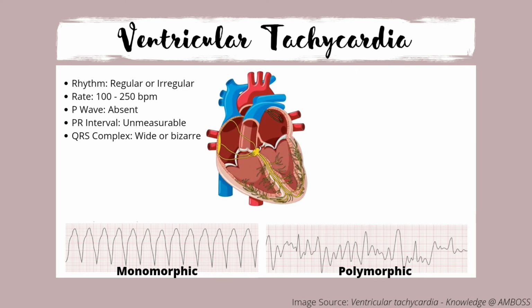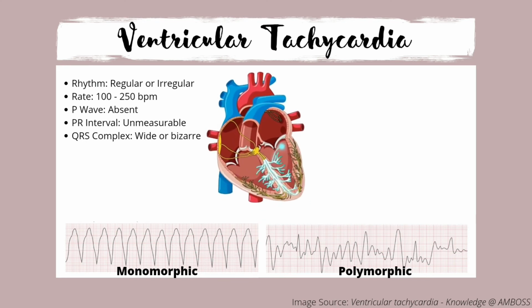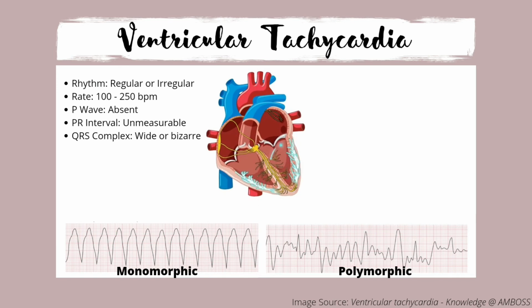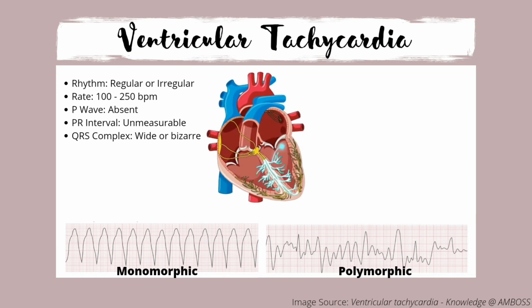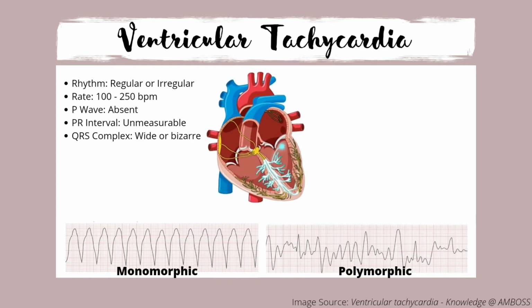Ventricular tachycardia, VTach or VT, is a fast heart rate arising from the lower chambers of the heart. Although a few seconds may not result in problems, longer periods are dangerous, and multiple episodes over a short period of time is referred to as an electrical storm. Ventricular tachycardia can occur due to coronary heart disease, aortic stenosis, cardiomyopathy, electrolyte problems, or a heart attack.